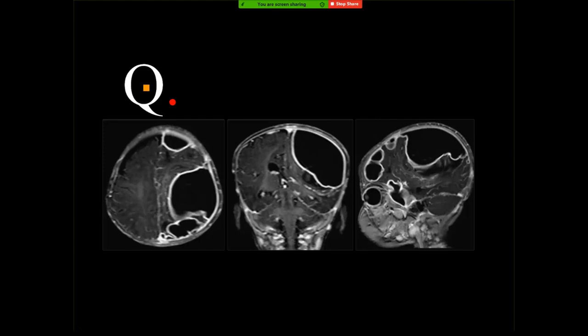Epidural hematoma. Abscess. Epidural abscess. Empyema, exactly. And then we think that this is epidural or hygroma. No, hygroma does not enhance with contrast. And you see this is marginal enhancement. Empyema, epidural or subdural. Epidural. Subdural.